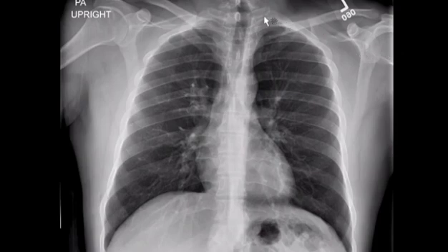Then what I do is I start at the right first posterior rib, and I count each posterior rib on down. I do this quickly with my eyes, but for the sake of this video, you'll see me follow each posterior rib. Then what I do is I come over on the left, follow all the posterior ribs up, so sometimes you can see a nice posterior rib fracture on these radiographs. After I clear the posterior portion of the rib, I will take a look at the lateral aspect of the rib, or the posterior lateral rib.